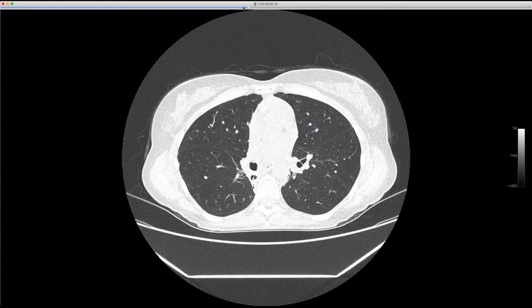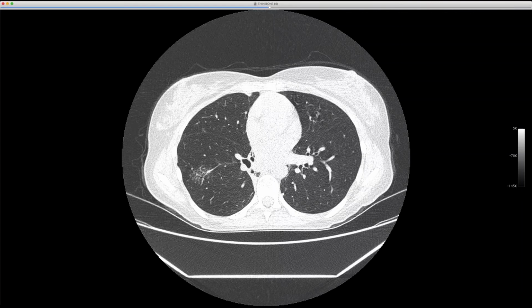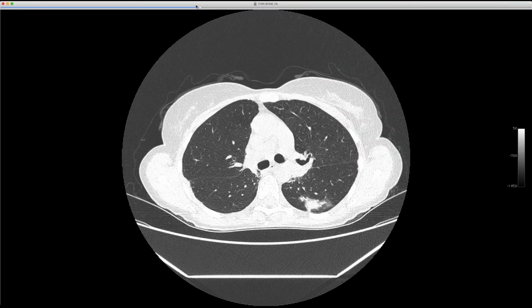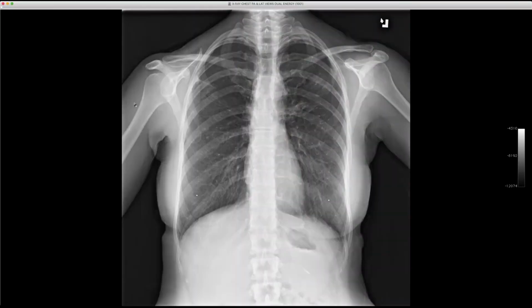Obviously, when one has one lymphoma, it's not uncommon to see another one. But yeah, this was a MALT lymphoma, and I thought this just looked like a galaxy sign all over. Not as classic as David's case. I must have been confusing it with a different one, but sort of that peribronchial and then the distribution. Here's the radiograph. You may have both, right? In each, you may have both. Yeah. So-called, people call it sarcoidosis lymphoma syndrome. Yeah, yeah. And then there's the radiograph just showing that opacity.